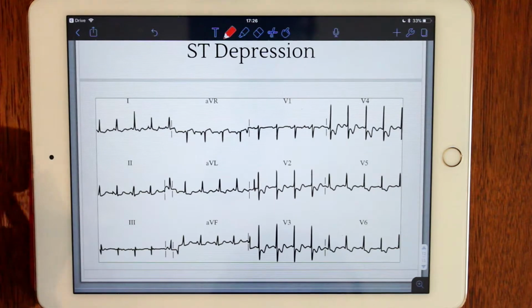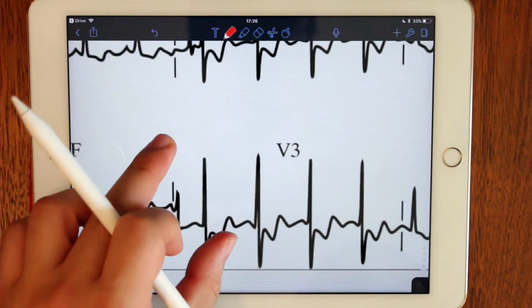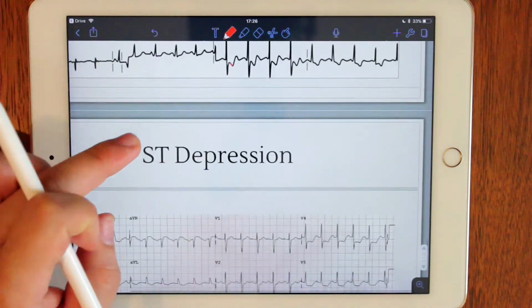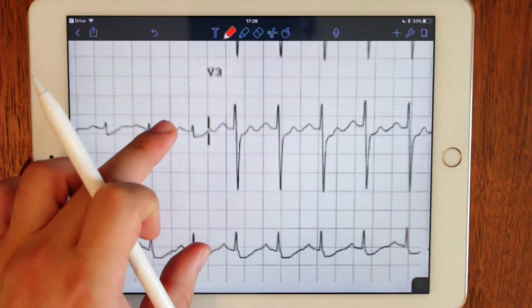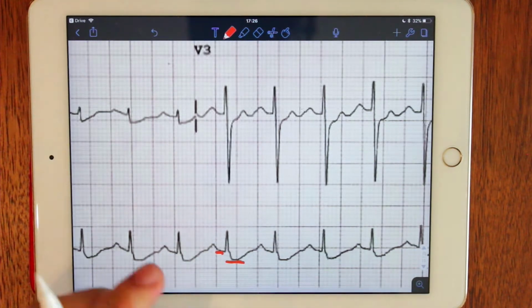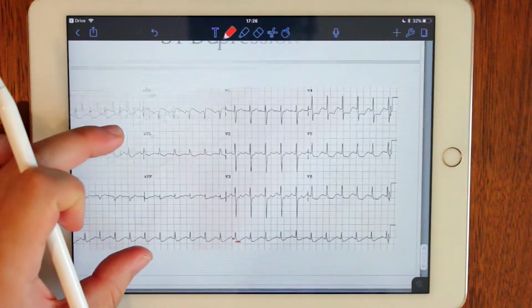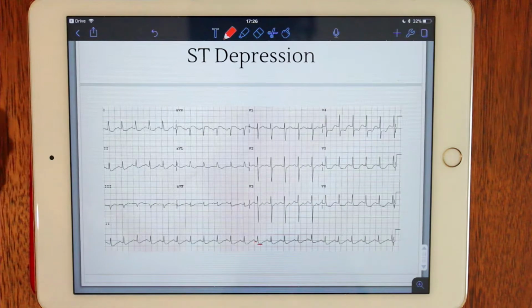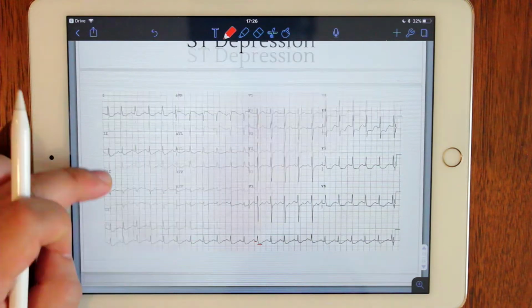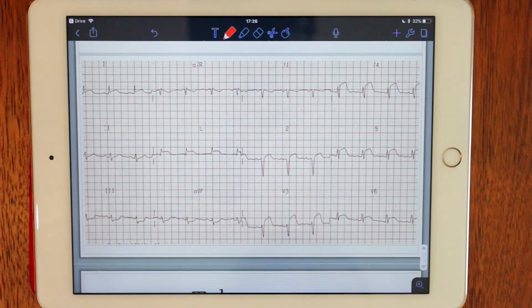Another form of ST segment depression is downsloping ST depression. That is much more dangerous and indicative of ischemia that might result in infarction. And finally, a non-sloping ST depression or a flat ST depression is also indicative of imminent infarction. So what you want to do is find your ST segment, compare it to the isoelectric line before to identify how deep that depression is. To be safe, anytime you see ST depression, consider it ischemia until you can rule ischemia out and identify, go get yourself a consultant or someone else who can verify the ECG for you.